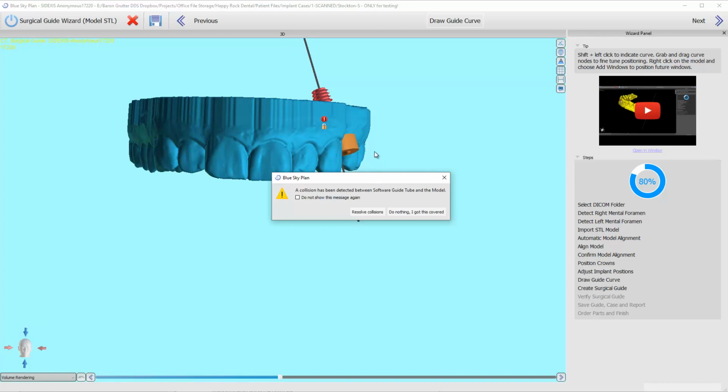I have changed mine to 20 degrees when the default is 30 degrees. I believe I've changed it on this computer. I can't access that part right now, but at the end of the video, I'm going to show you how to do that. So if you only care about this part, zip to the end of the video and you should be able to find it.